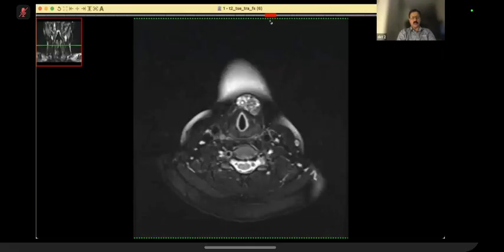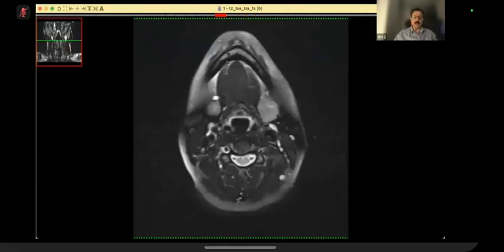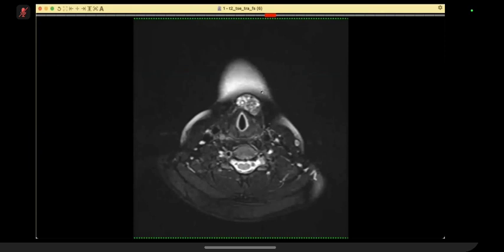Over to you. Okay, just checking if I can see any abnormality. So let me point it out to you. Just 1 second. I'll move the mouse. So don't move the mouse. Okay. Concentrate here. What is this?